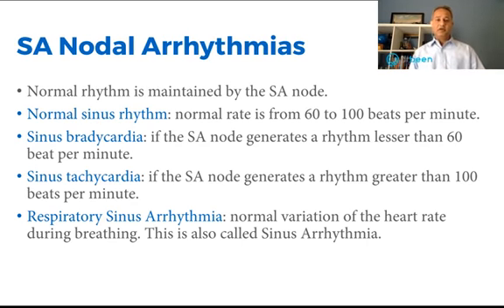Please do not try to identify sinus arrhythmia on a simple strip and say, I know this is sinus arrhythmia. Normally, sinus arrhythmias are identified when the EKG is superimposed on the breathing pattern. And then you can say, well, look, here is the inspiration, and with each inspiration, there is a little faster rhythm. And here is the expiration, and with expiration, there is a little slower rhythm. And it is that way again and again. Then you can say this is sinus arrhythmia.